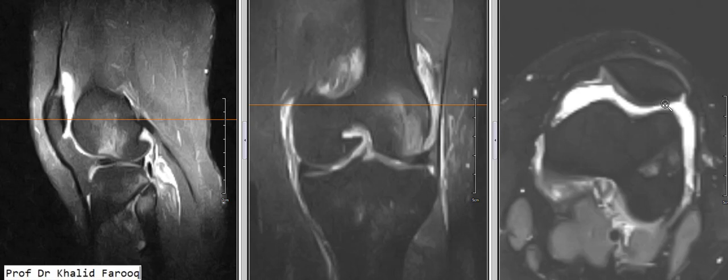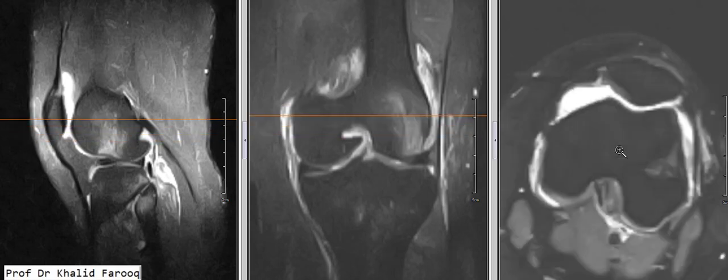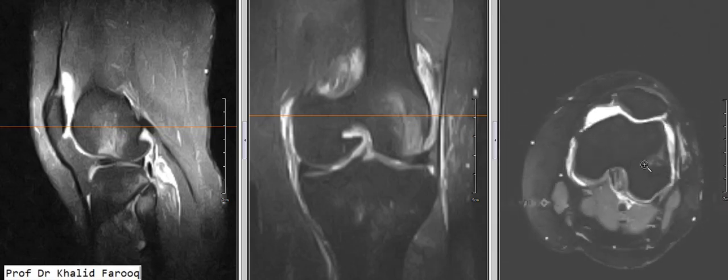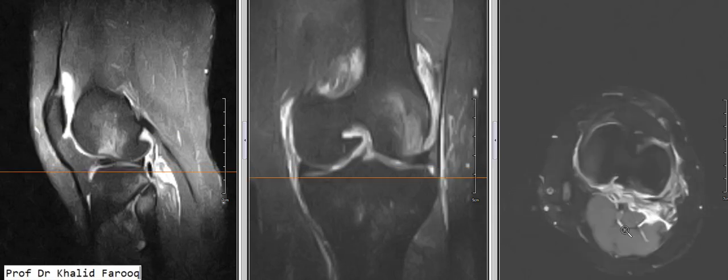This is normal retropatellar cartilage, and medial patellar retinaculum is normal as well, while there is mild sprain of lateral patellar retinaculum. We can see bone bruising along outer aspect of the lateral femoral condyle. Significant soft tissue edema is noted involving popliteus muscle and soft tissue in popliteal fossa.